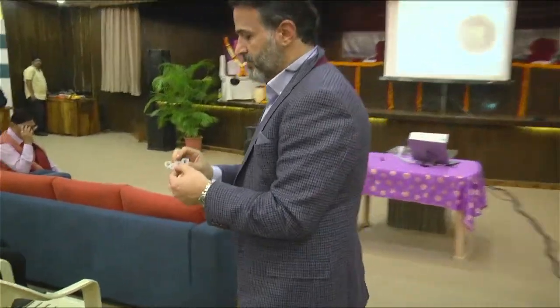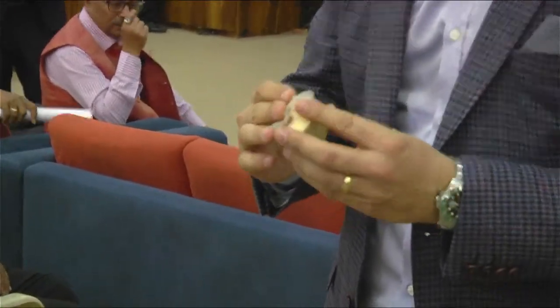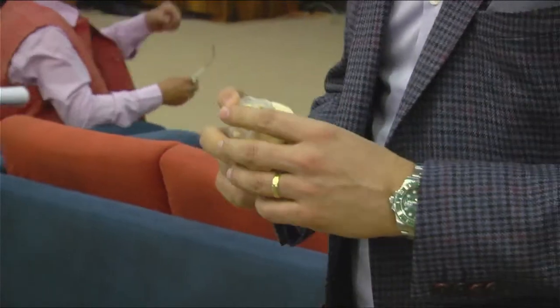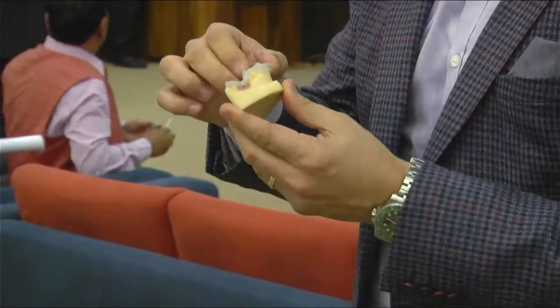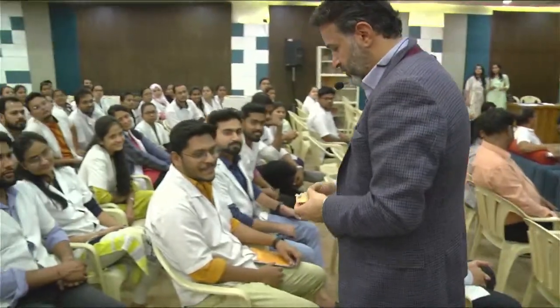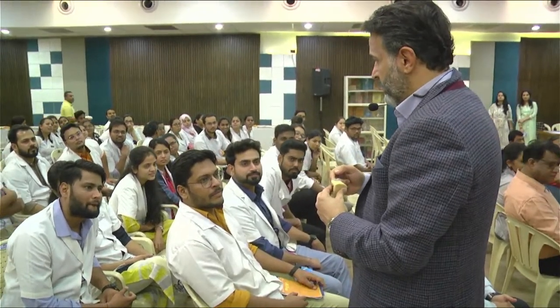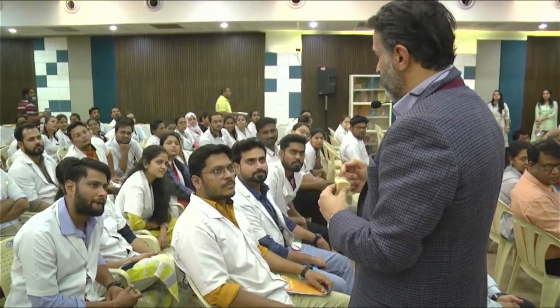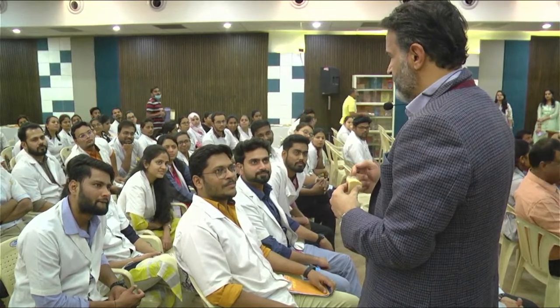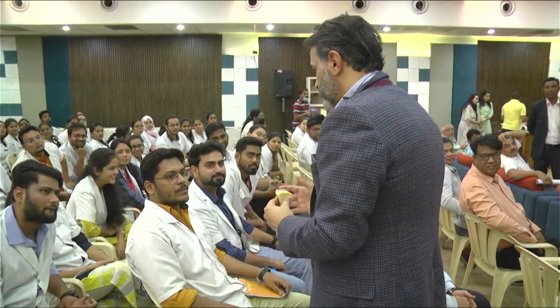It is an industrial item. And we have sleeves, we have clamps. And once we put it, it is a tooth-retained guide. Then it doesn't move. Then it is very easy. Yes, doctor. It's very easy to put the drill inside. And the second rule, you must close your eyes, okay? Close your eyes and pedal, and it's over, okay? You don't need to open your eyes.